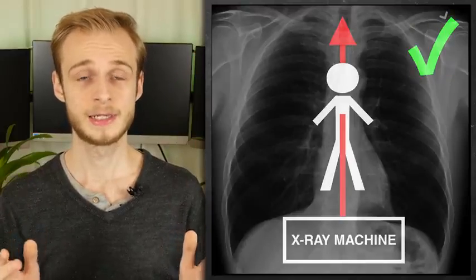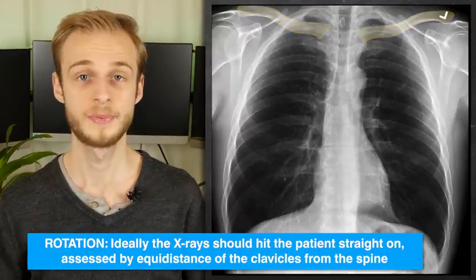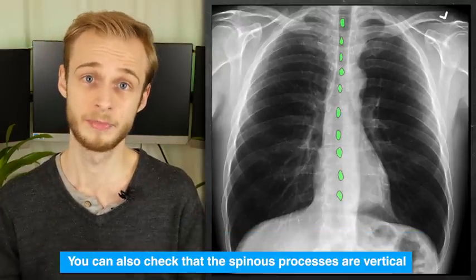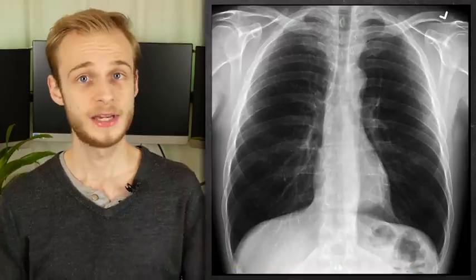The way this is assessed is by looking for the medial parts of the two clavicles and checking that they're equidistant from the spine. And the spinous processes should also be vertical, or roughly vertical, when you're looking at these images. In this case, it's not perfect, but you are looking for something grossly abnormal to know that something is wrong.